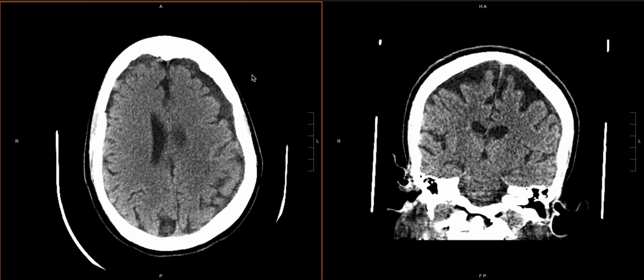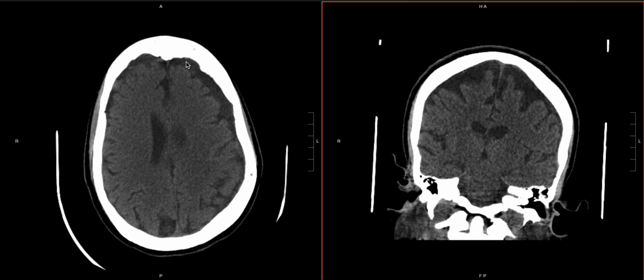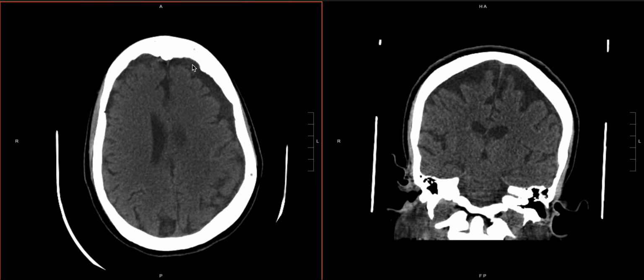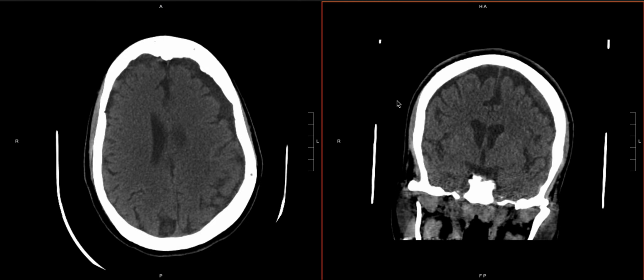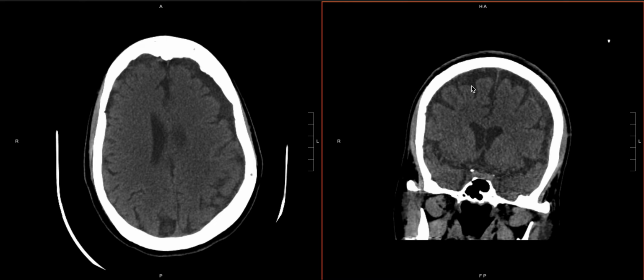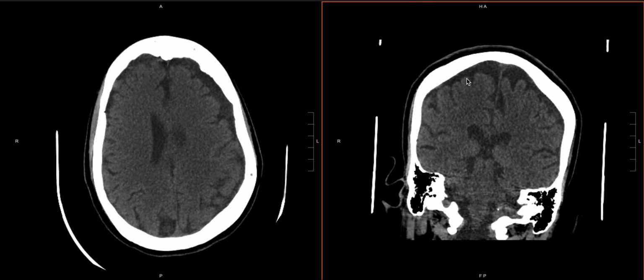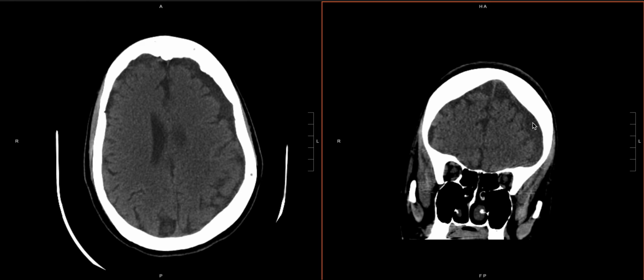So first things first, we're going to window our reformats here in a more traditional subdural window so we can get a better look at things. But already as we start looking at this, we notice that there is a large extraaxial collection here that's pushing the parenchyma away. And when we look on the axial as well, we see it especially on the left side, but actually it's also on the right side, which we'll take a good look at here on the axials, and we'll corroborate everything, but we can see it here on the coronal.